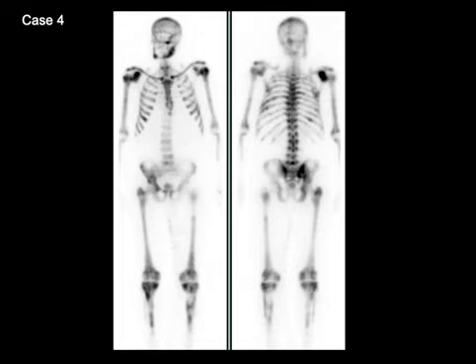Another patient with disseminated osteoblastic bone metastases seen in the anterior and posterior views. This scan is approaching a super scan pattern where there is hardly any renal activity visualized, there is faint urinary bladder activity, and there is almost no soft tissue activity. So when there is diffuse osteoblastic bone metastases, there is intense diffuse uptake in the skeleton, and that pattern is called a super scan pattern.